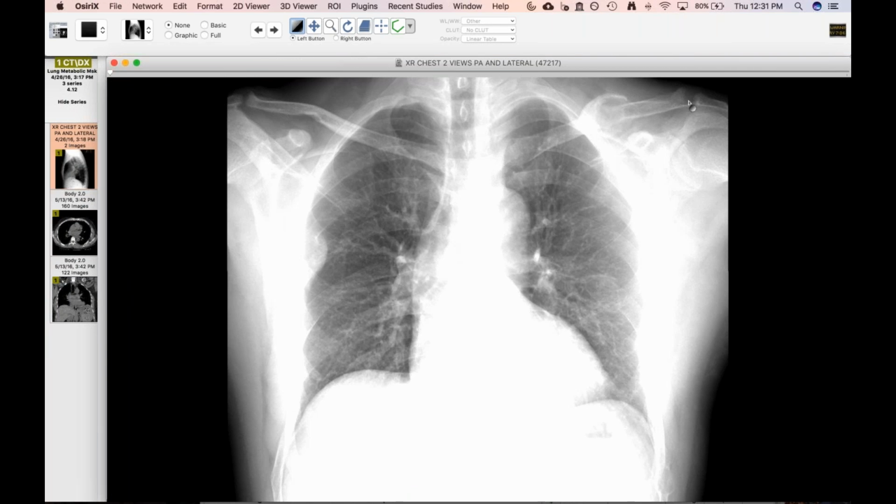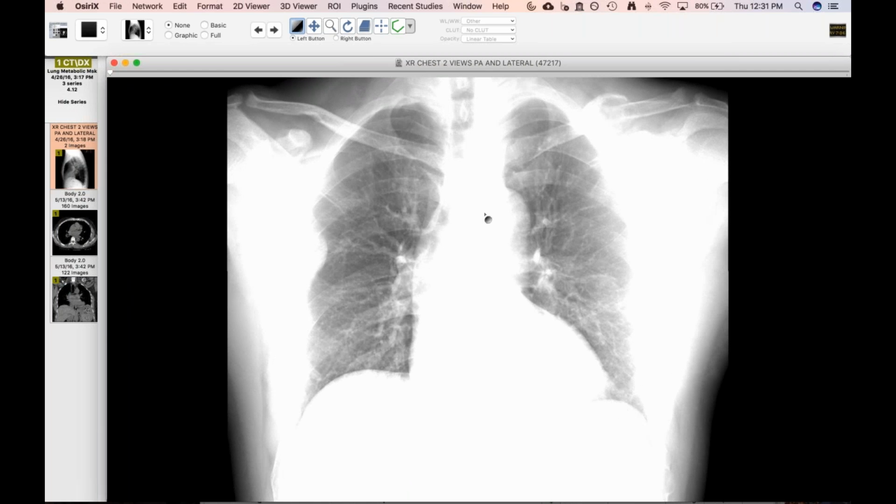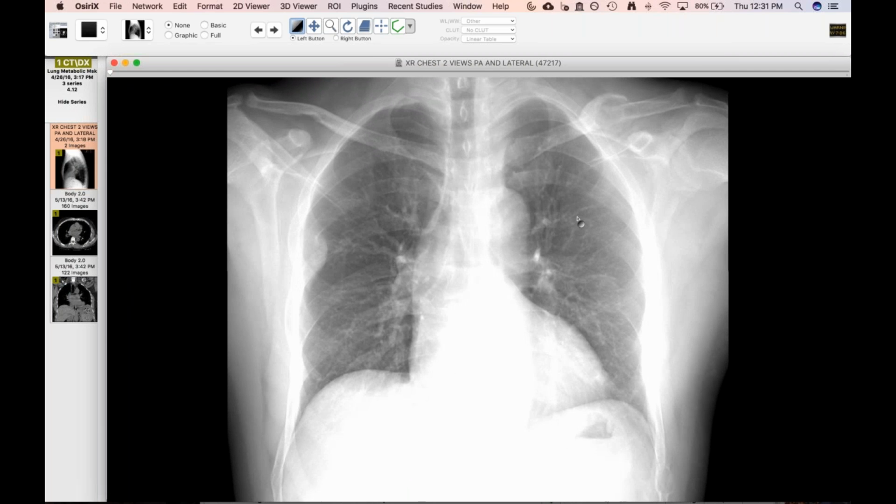Travis? I've not seen a case of brown tumor of my own here. I've only seen a couple that other people have, like Tom sent one a few years ago. Yeah. I'll take your word for it. But I think you always comment on the distal clavicular resorption. Yeah, this is beautiful. Oh, it should be, and right here too. The acromioclavicular, what is coracoacromial. Yeah, that's perfect.